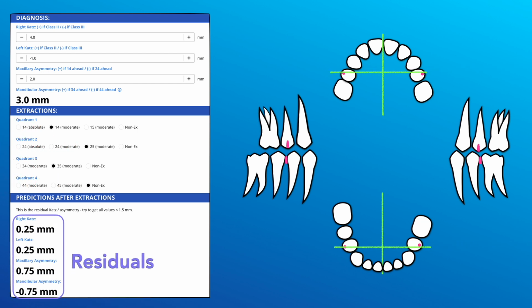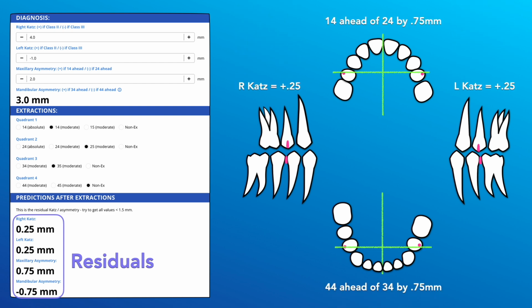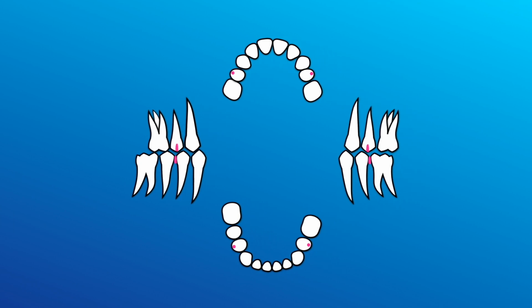The calculator residuals using Supercalculator and the simulation have worked out to essentially the same thing. All of our residuals are now less than 1 millimeter. Because we extracted the right teeth, the remaining discrepancies can easily be corrected with minimal elastic wear.